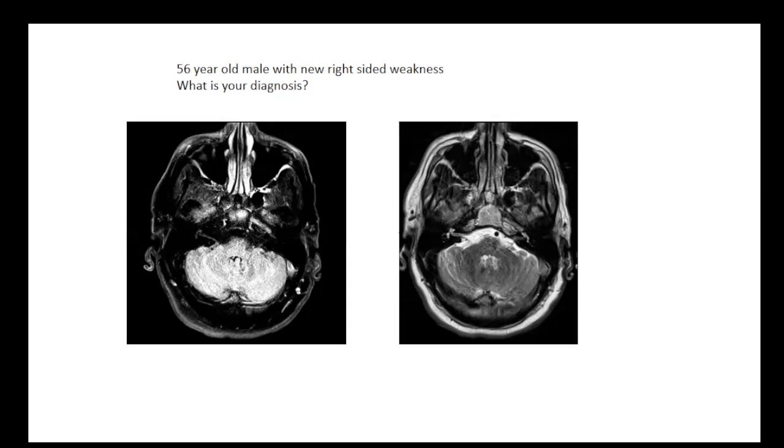And if the flow is not sufficiently quick, or the velocity is not high enough to give you this property of dephasing, you'll get this kind of slow river, sluggish flow, which you can actually see on MR. So anyway, get that in your mind. This is what you want to be looking for in patients with carotid disease.